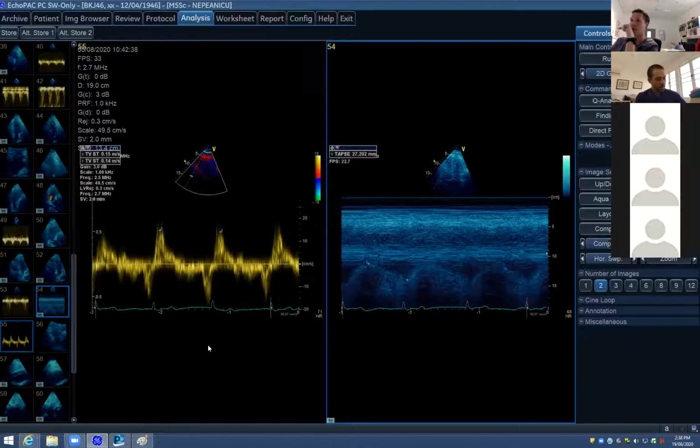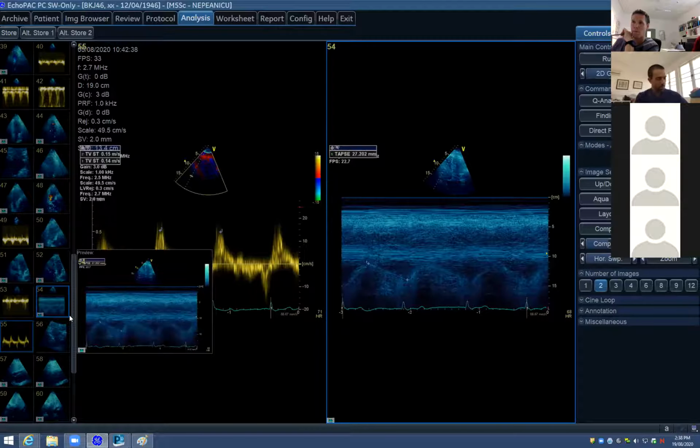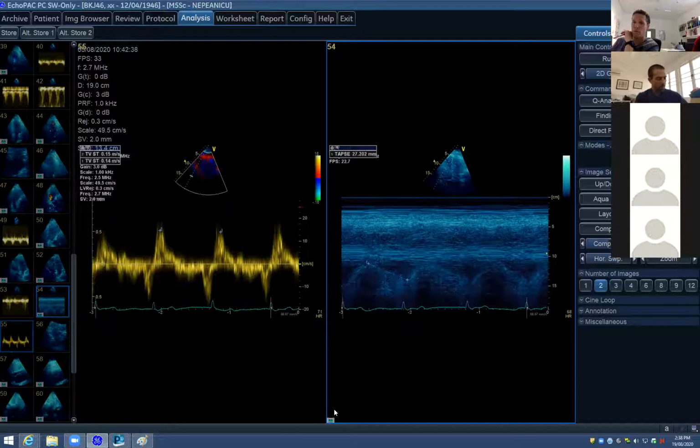Sorry. I guess it can be divided into eyeballing it, and then also looking at measures of global systolic function, so fractional area change, more than 35. Beautiful. TAPSE more than 16, and then RV S prime of more than 9.5. Fantastic. So all of these markers, and fractional area change was about 40% or something here, suggest normal RV function.